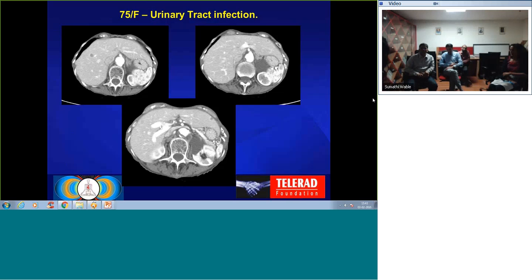If you look at the old literature, there's so much description about dysplastic versus hyperplastic nodule, but it's a continuum. It's very hard to separate those out. The main thing is once they start enhancing arterially, then they fall into the HCC category. There are some in between, and maybe those are the ones we cannot tell.